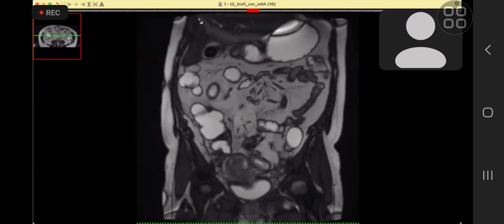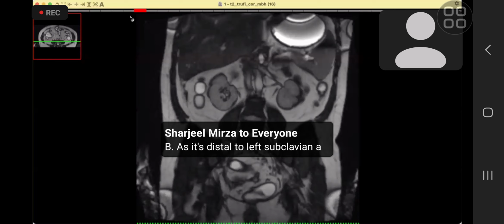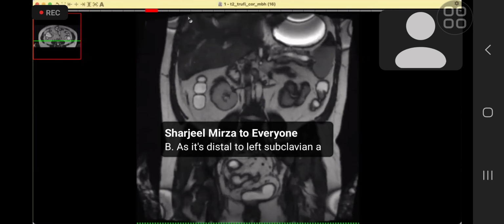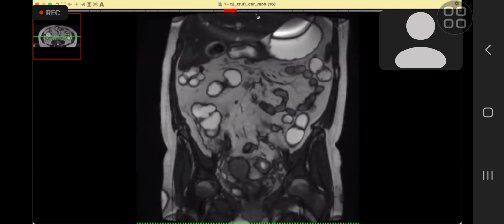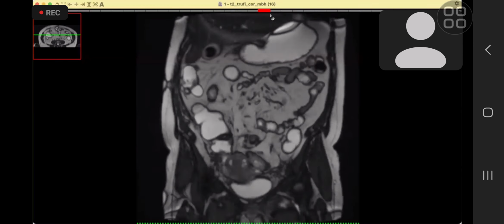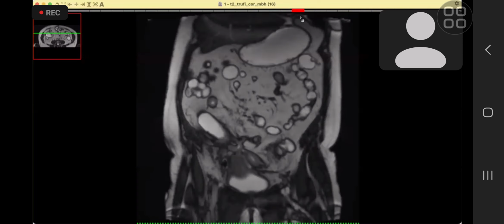I'm presented with a coronal T2 scan of a female patient with chronic diarrhea. There is quite normal distension of the small bowel loops, I believe with mannitol, and there is abnormal isointense signal intensity seen in the right iliac fossa involving both sides of the mesenteric side of the colon and the mesenteric side of the terminal ileum and the cecum, with heterogeneous intensity.